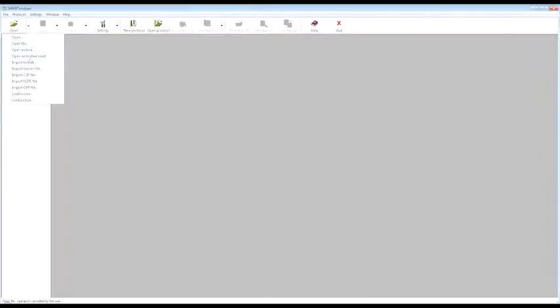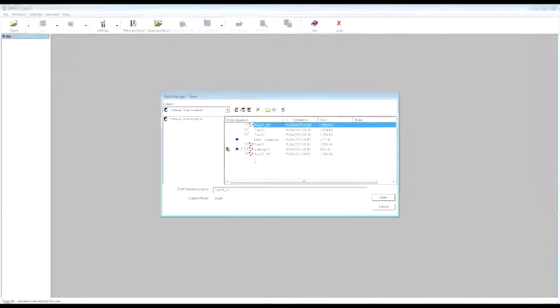Otherwise, you can import a file containing a normative band, which has an extension of AENB, which contains information about the normal range of data. Otherwise, you can import a TXT file or other kinds of file formats that can be loaded into the software. One example is the C3D file. So in this case, I'm going to click on Open. After that, a window will appear containing, again, the folder that contains my data. So I'm inside the Webinar Smart Analyzer folder.